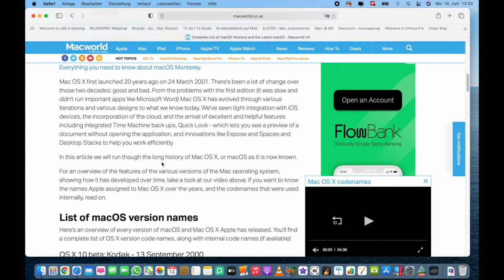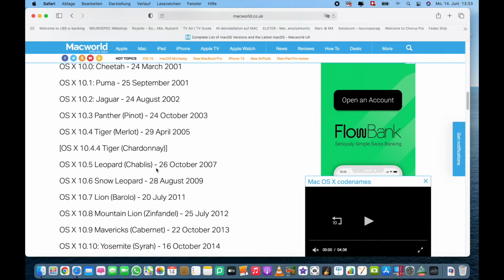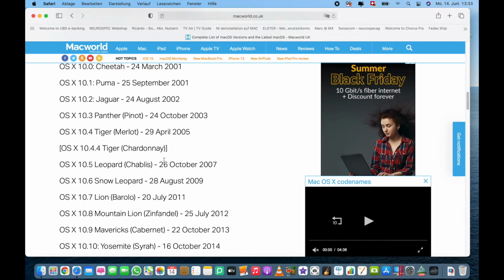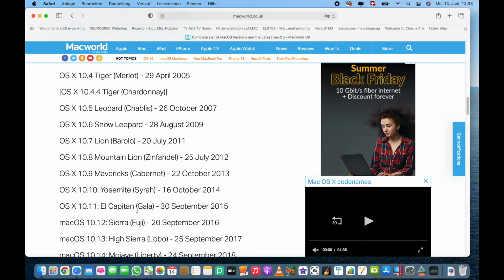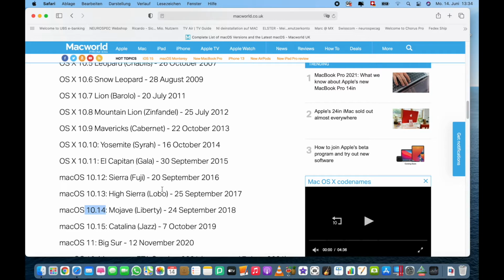We're just looking quickly at the previous versions and the versions that are still compatible to run the runtime engine 2016 and ActiView. So basically, if you had still El Capitan, if you had Sierra, if you had High Sierra, all the way to Mojave, which is macOS 10.14, you would find no reasons why not use the runtime engine 2016 and ActiView from BioSemi's Mac section of the website for downloading software.